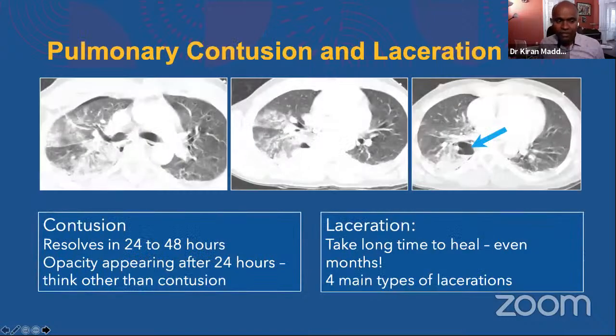Whenever you're looking at a pulmonary contusion, look carefully for any areas of elliptical shaped cavities, which are very common in trauma. These are pulmonary lacerations. Lacerations in visceral organs are slightly different from lacerations in the lung parenchyma. Lung parenchyma has the highest elastic recoil. So whenever there is a cut through the lung parenchyma, it tries to contract in an elliptical way. That's the reason why you see a cavity-like lesion instead of opening up of the tissue.